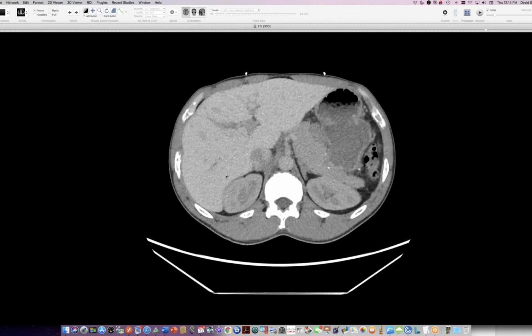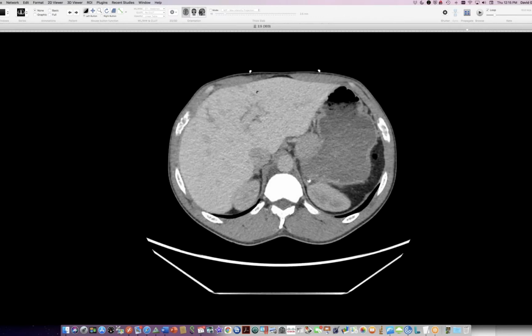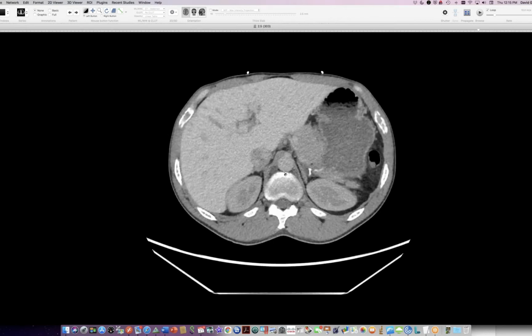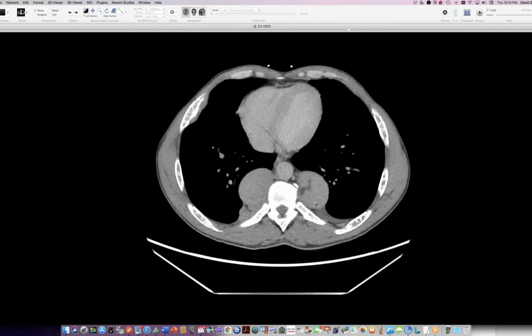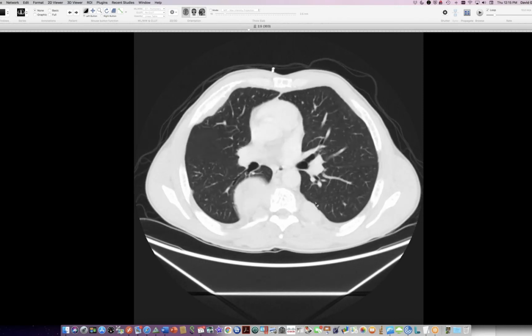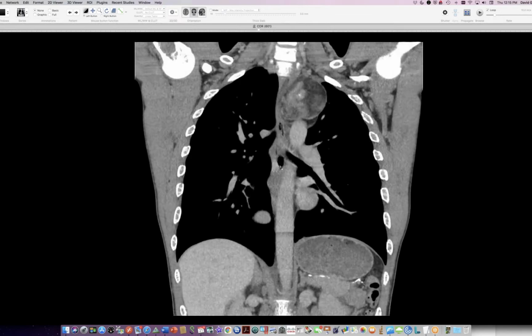Now he has had a splenectomy, so somebody might have been attuned to this, and he has a dense liver, as if he's received a lot of transfusions or has a high degree of iron turnover here. If you told me, these might be signs of treatment, but the guy did not give us any history of that. So it's kind of frustrating, because you'd think that he would have a solid diagnosis of beta thal by the time he got to his 40s. But a rather dramatic case of extramedullary hematopoiesis.